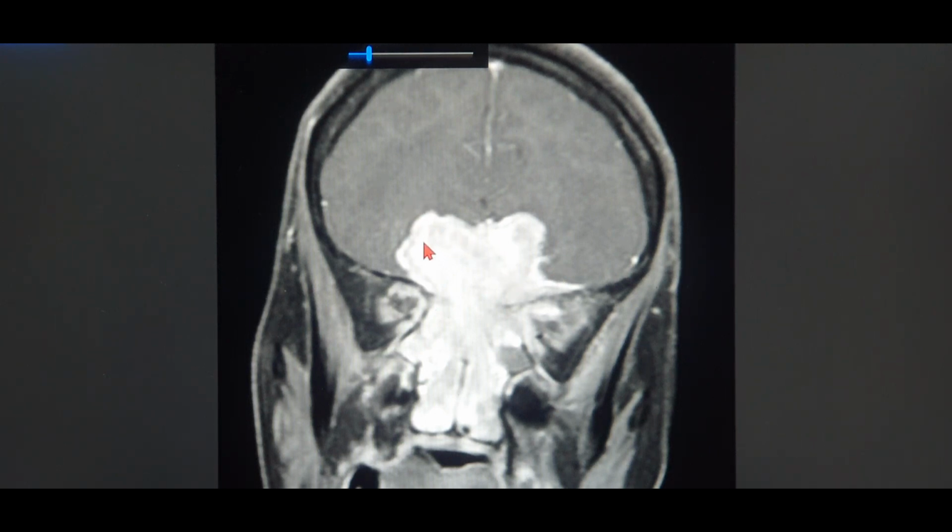Because of the contrast, you can see the post contrast enhancement is huge. This is a huge intracranial component. The skull base, as you can see over here, the black line has a huge discontinuation in this region, and this is on both sides. Normally olfactory neuroblastomas commonly have septal involvement. They destroy the septum and midline. So maybe in this patient it may have destroyed the septum and midline and crossed to both sides. So this is having the same hyperintensity over here.